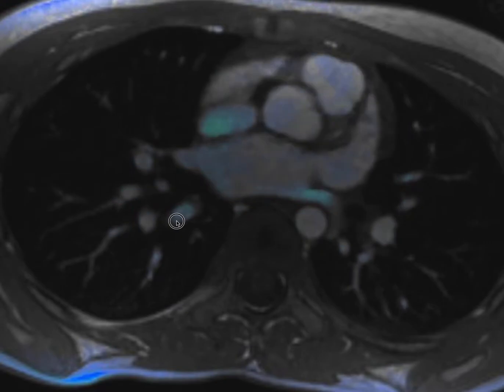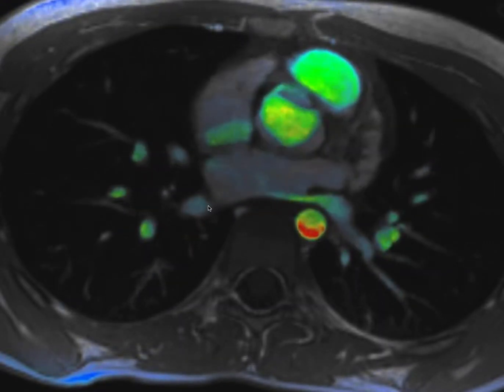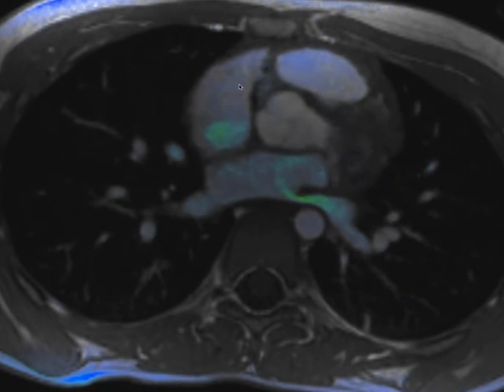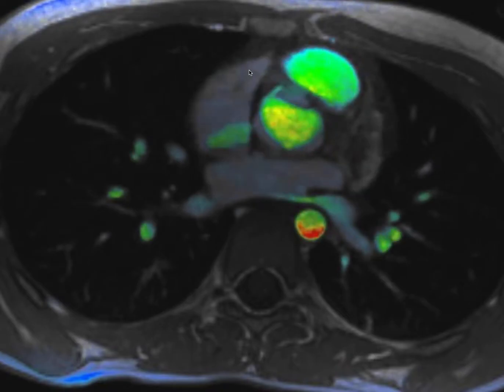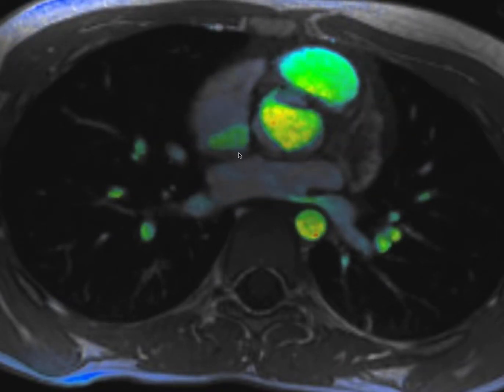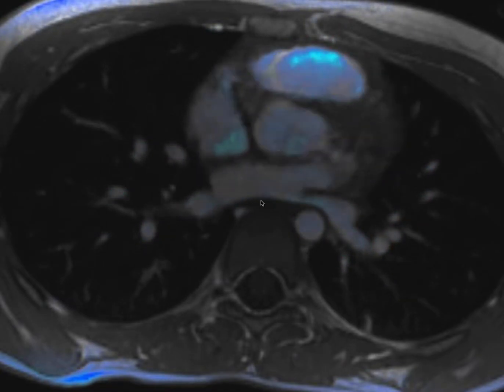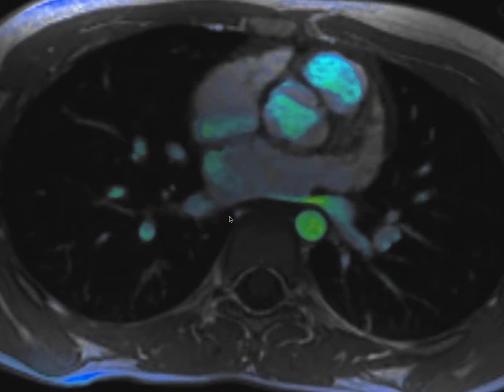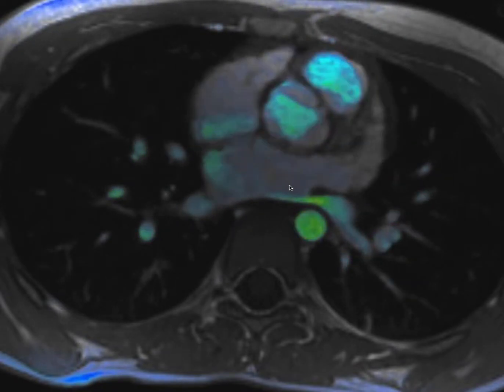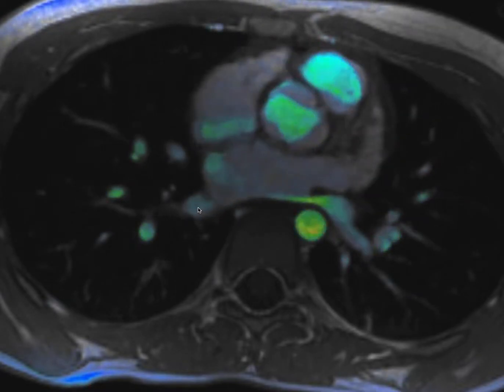This vein is coming back to the heart, and you can see another vein here coming back to the heart. These 2 veins are going to the left atrium. So remember, here was the right atrium with the right atrial appendage. Here's the left atrium with the left atrial appendage. In between the 2 atria is the interatrial septum. Now in this particular case, not all the pulmonary veins were going back to the left atrium. That's abnormal. I'm just going to focus on the normal anatomy in this case.